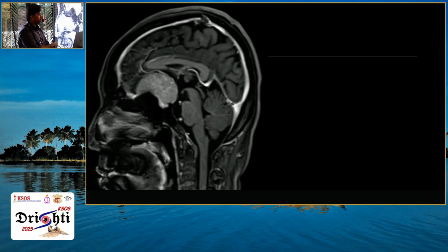You can see meningiomas are tumors of the brain layers, that is, dural sheath layer tumors. And these meningiomas always have a broad base towards the dura. This is a case of a mildly enhancing lesion. This is a meningioma. Why it is not a pituitary lesion is because there is a small enhancing gland over here, which does not look like the mass over here.